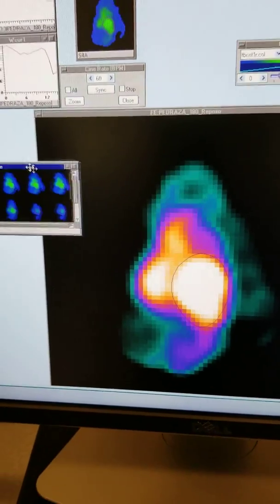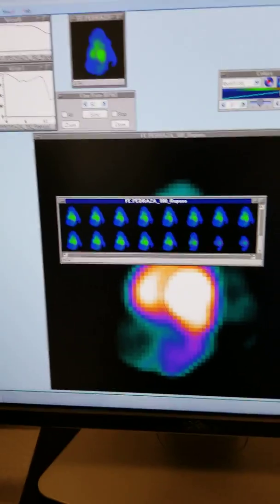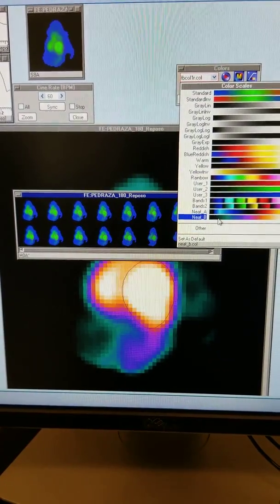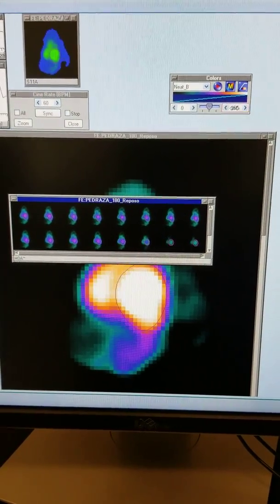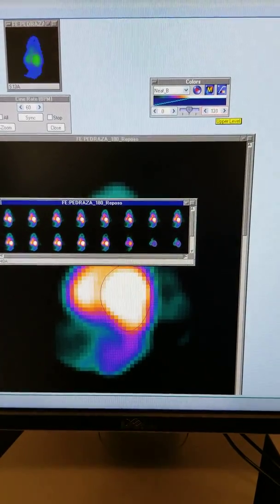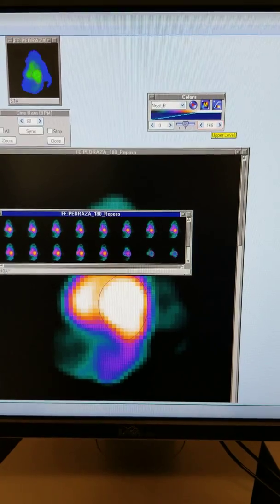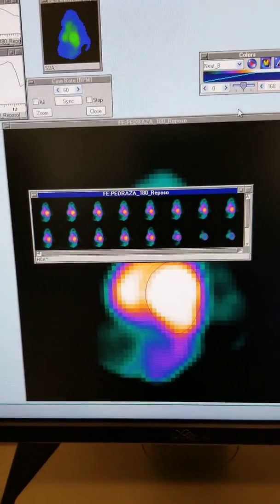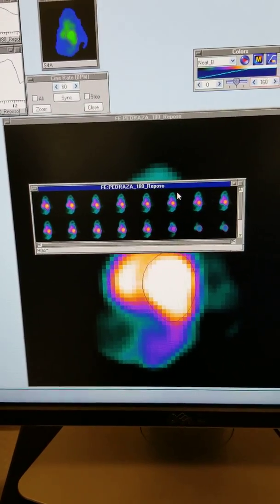Okay, so what I should be able to do now, see this bad boy? Hey, we need to first put it in neat. Okay, adjust your brightness. Okay, remember we liked it at about 165, 175, somewhere in there. Adjust our size so that we can see everything nice and clearly.